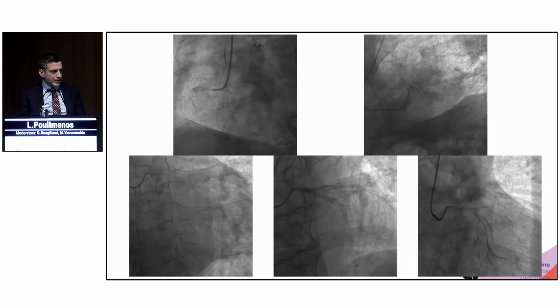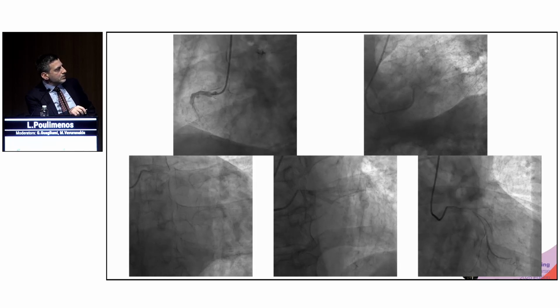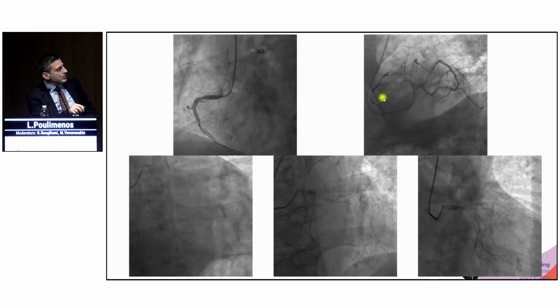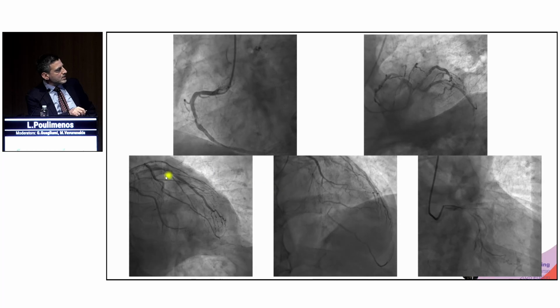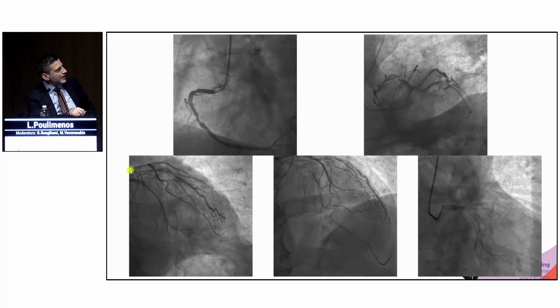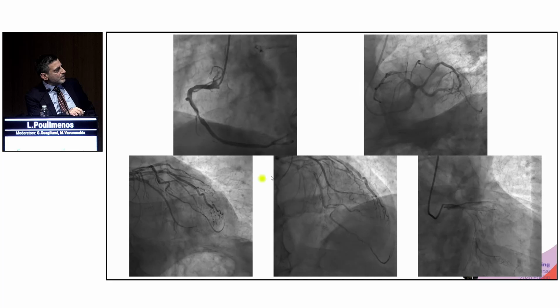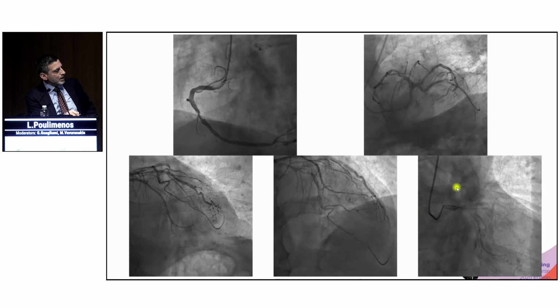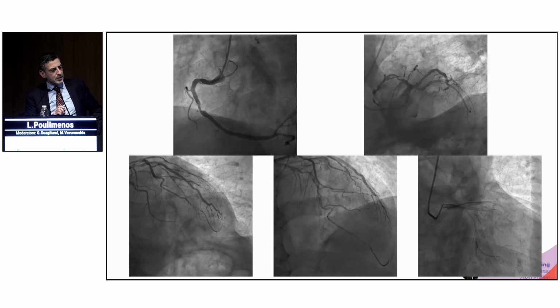And after that, everything was done in another hospital. He had this diagnostic coronary angio, and when there is no contrast medium, you can see the calcium, a fair amount of calcium. There is something else at the proximity of the LAD, maybe an ulcer. I'm not sure; we're going to discuss this after imaging. And they just stopped there, and that's good for the patient.